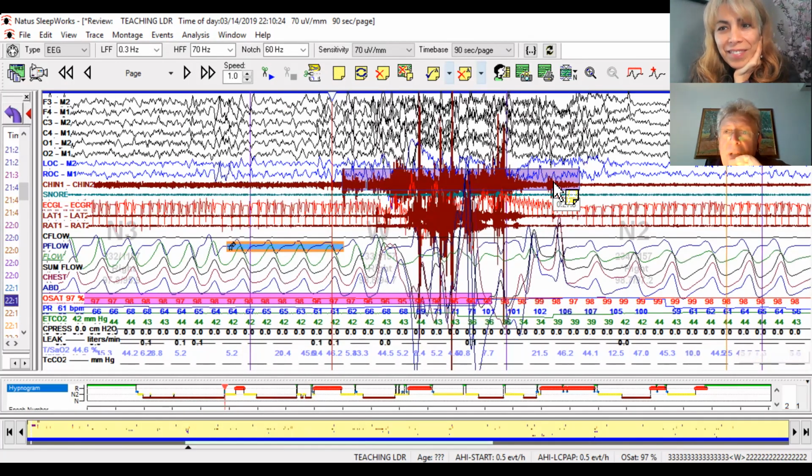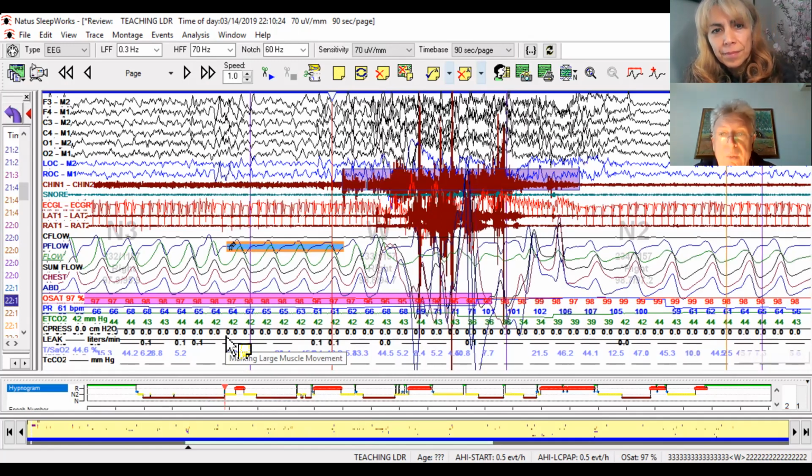You see, I've got a good eye. Good eye. So it approaches the maximum that we have set. Looking at the EEG, it is just alpha waves, it's not movement in the EEG. So these are the limits of this movement.